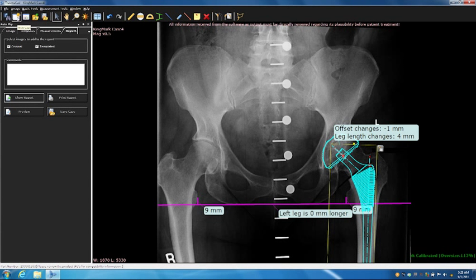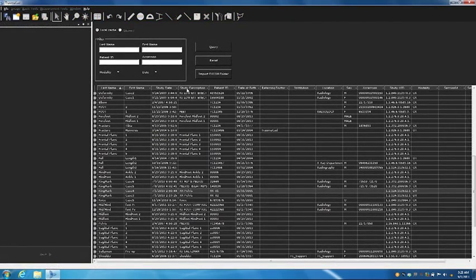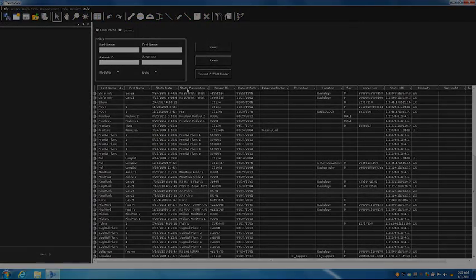All right, so if you click on the new case, we'll back all the way out and we'll let Sean get started with the deformity side of things. Thank you all.